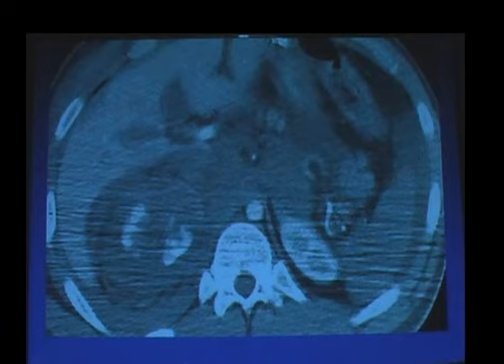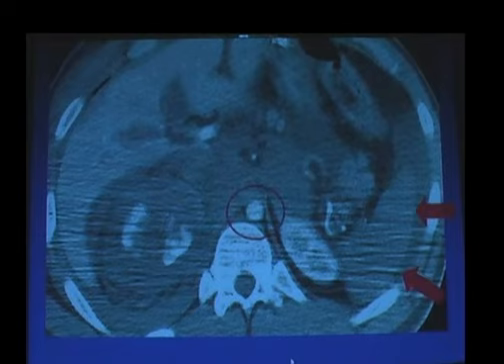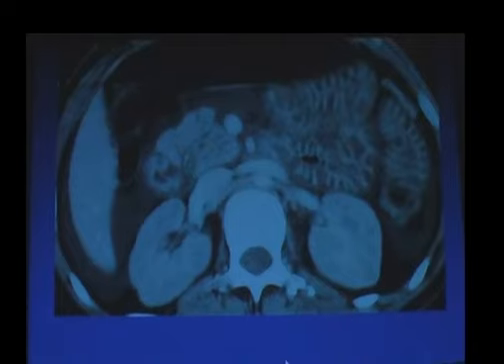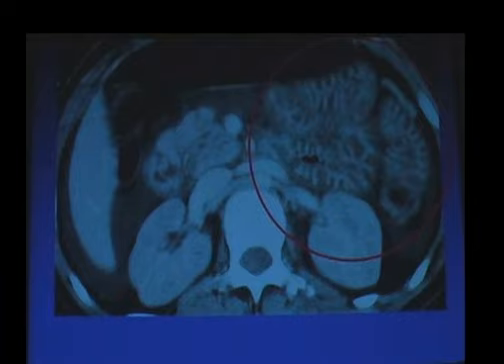This is another patient, again, globally decreased spleen size and decreased splenic enhancement. You can see this patient had a shattered right kidney, large amount of hemoperitoneum within the abdomen. Look at the small size of the abdominal aorta in this case. And this patient also had shock bowel. This is the classic CT appearance of shock bowel, where you see this very bright mucosal enhancement of the bowel wall, which is typically fluid-filled.